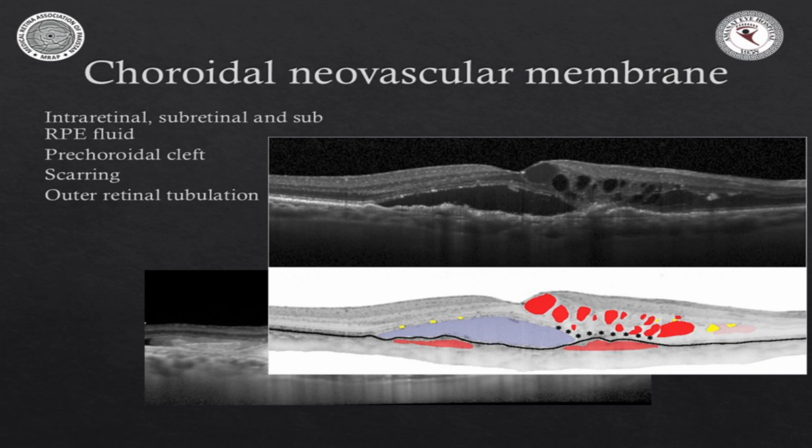You would still call this sub-RPE fluid, but the optically empty space lying under the CNV is not fluid. It's most likely not fluid, especially in a case which is giving you a history of repeated treatment. It's just shrinkage, a lacuna, like a lacuna forms. It's not VEGF mediated and it's not leakage mediated. Of course, it can't be air. But the thing is that this is not a leaking CNV. More so it's because of repeated treatments with anti-VEGF. So it's a shrinking CNV.